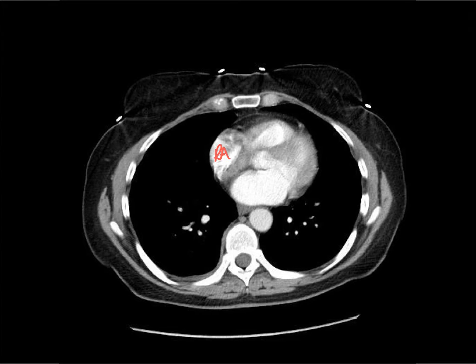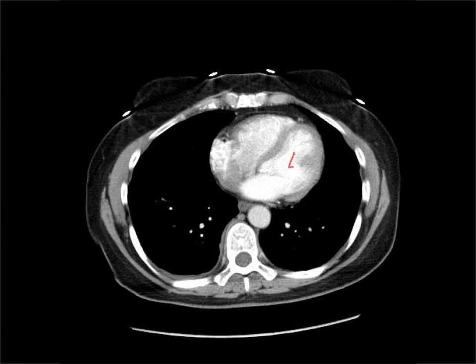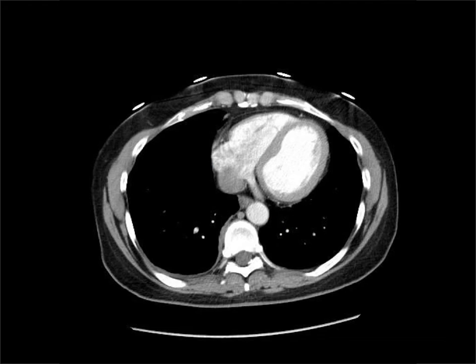We're still in the right atrium, still got the left atrium, getting into a little bit of the left ventricle, and we're into the pulmonary outflow tract. Lower still, left ventricle, little bit of left atrium. We're probably coming into the IVC here, right atrium, maybe IVC, and here is our right ventricle. Obviously that's descending aorta. Lower still, left ventricle, right ventricle. This is a coronary vein, and here we're probably pretty much into the IVC.